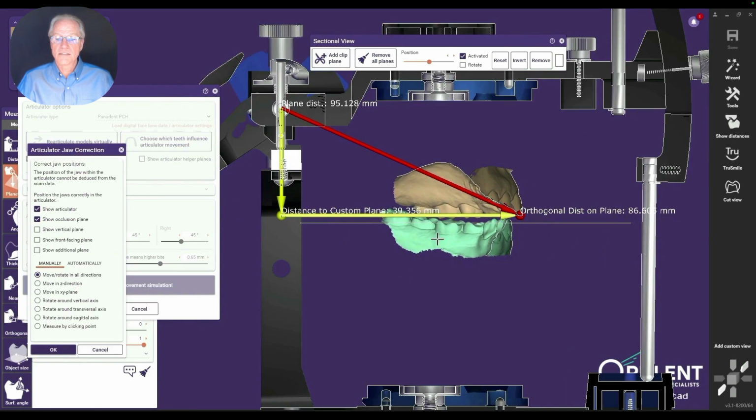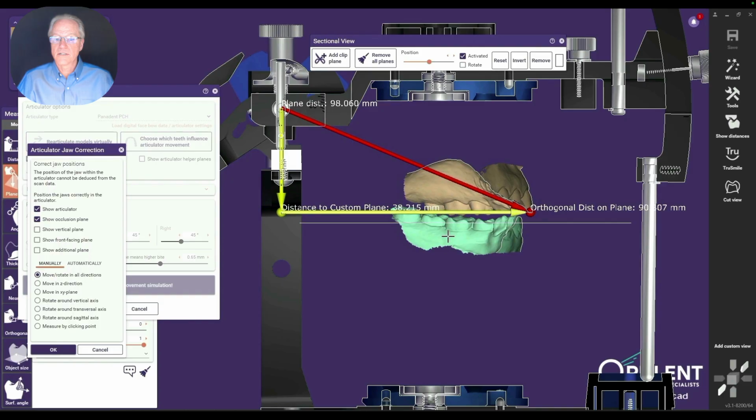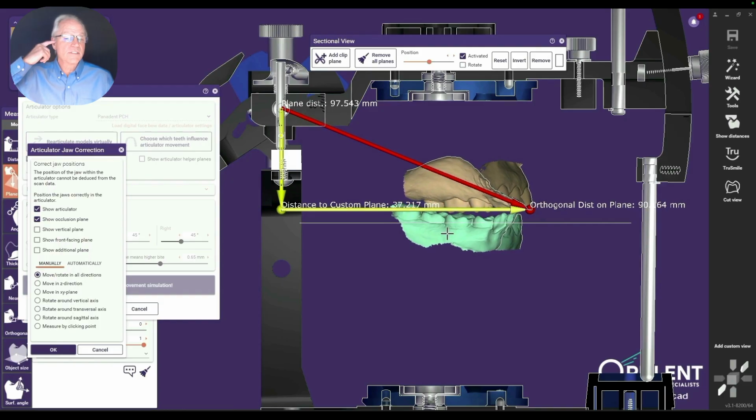So if we've done that, you can go into your articulator and then you can do the measurement down and out to the incisal edge. So you have an estimated hinge axis mounting within the Exocad digital articulator. It's still a functional plane of occlusion at this point in time.